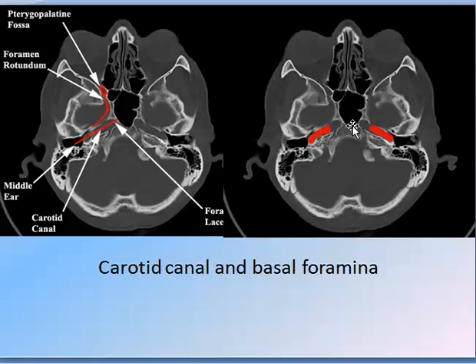You have here the foramen rotundum, and you have here the carotid canal, reaching to the carotid foramen.